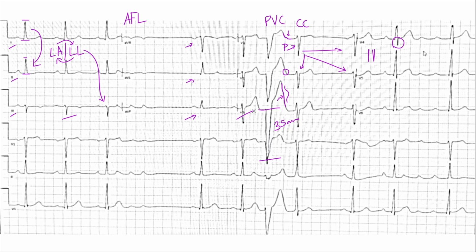So if you think about where lead V3 is positioned, you're talking about the septum here. Anterior of the heart or the septum. And so there's something going on here. Something is definitely going on here. This patient is symptomatic. We're having intermittent atrial flutter. Okay, the leads are not working in our favor. But something else is going on here.